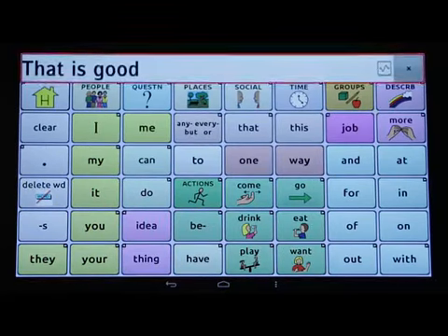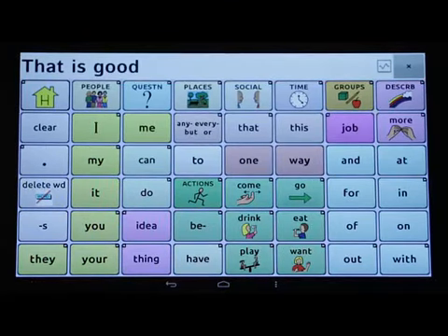That is good. As you can see, there are many options available for users that benefit from a switch access method. Many vocabulary options are available, but also will need customized to fit the client needs. Adjusting settings, patterns, and visual effects can make a huge difference for the individual using switch access for their AAC system.